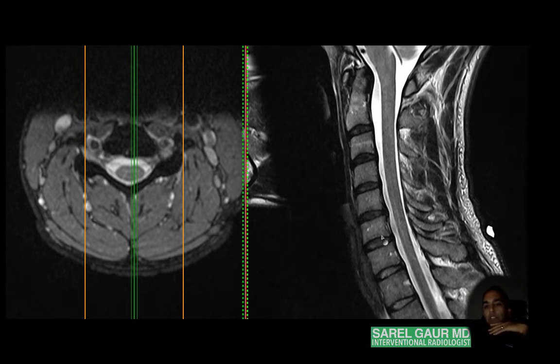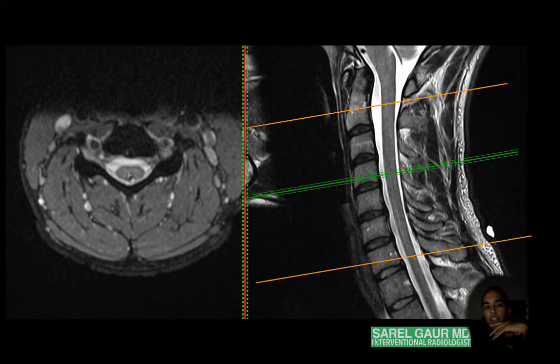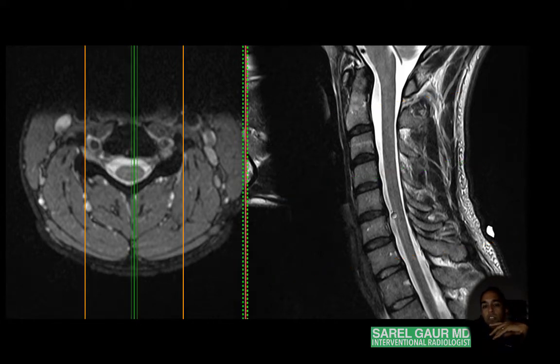The column gives you stability, it gives you height, it's how your body allows you to stand upright. And then you have the cord, which is very sensitive tissue extending inferiorly from the base of the brain down, and then innervating your body at each level as it splits off into nerves. So again, just think cord and column.